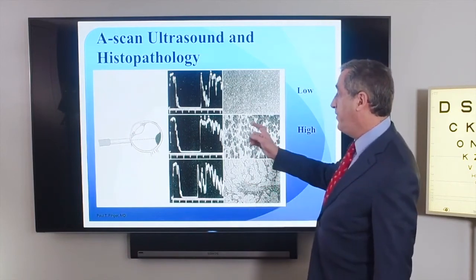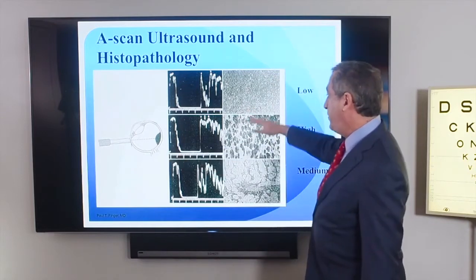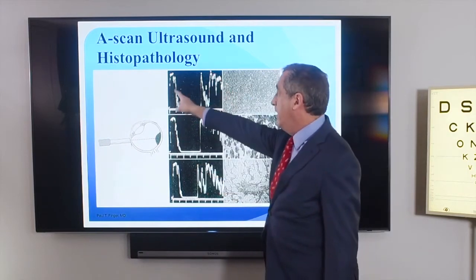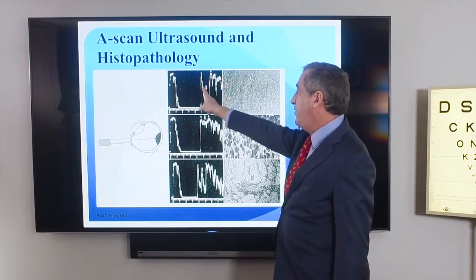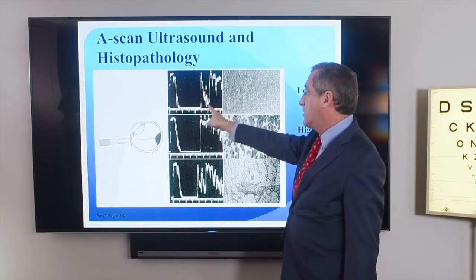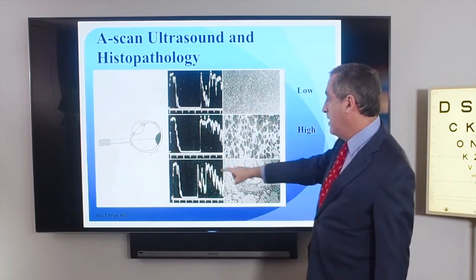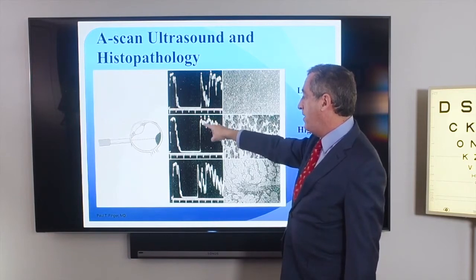So another way of looking at A-scan in terms of ophthalmic oncology is to use it to look at the inside of the tumor. In these three cases, we have different internal reflectivity within the tumor by A scan. Here's the tumor spike, the apex, sclera, and this is what's inside the tumor. In this case, we see a 45-degree angle going down and a very homogeneous tumor. That's melanoma.